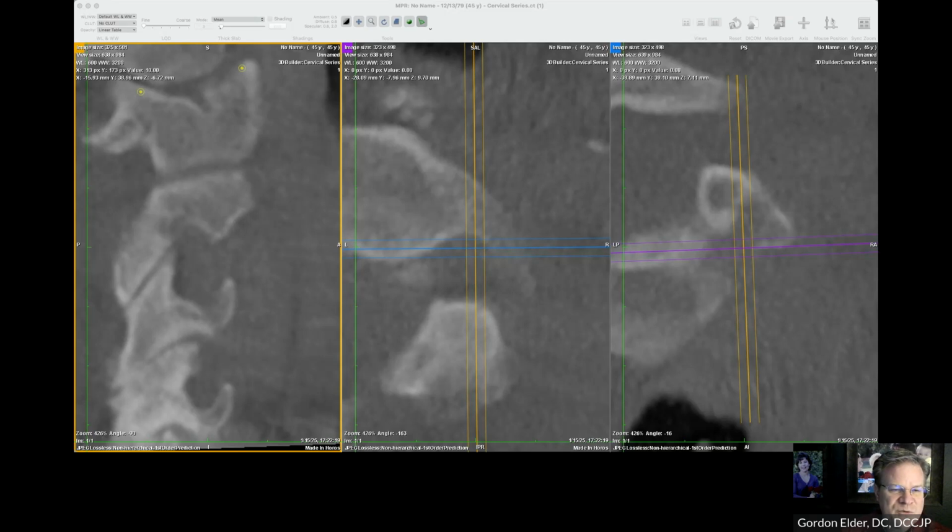Kobe, I would love to see how you capture video synopsis of the 3D view in MPR at a later time. Okay. It depends on the program. In the 3D, when you're looking at it, there is a way to export it with movie. But what I did was I just took a screen video clip, and it's easy with a Mac. I know it's possible also with a PC. I don't remember exactly how to do that. But I don't mind going over that with you later.